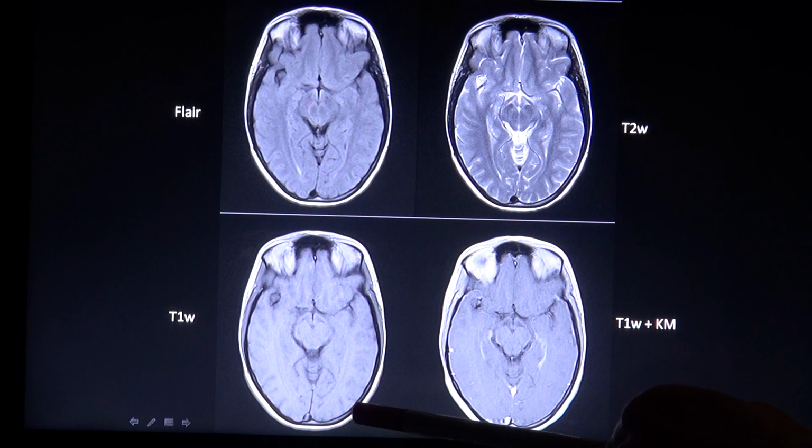You can recognize a T1 image because basically it looks like a CT scan, with the ventricles being dark, whereas the skull is bright. In contrast to a CT scan, the orbits, which contain fat, are also bright, whereas the globes, consisting mostly of water content, are black.